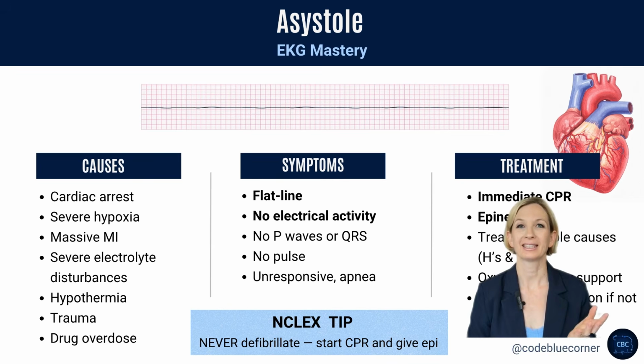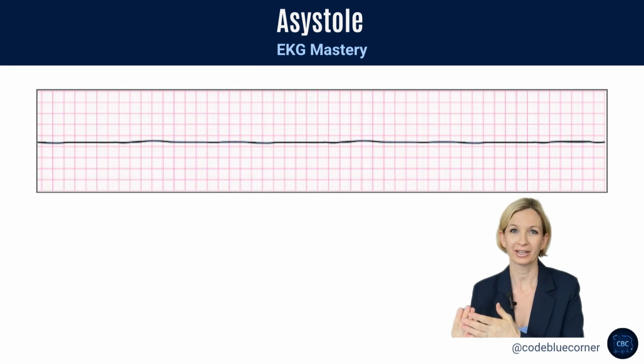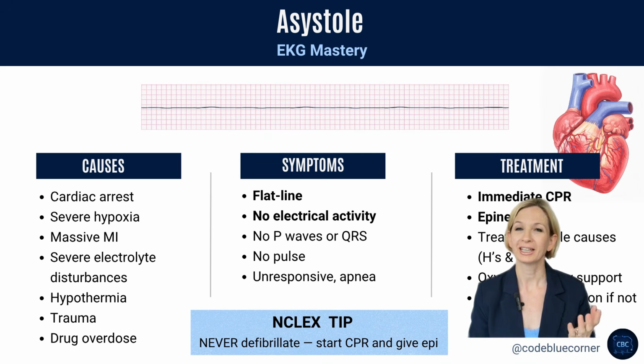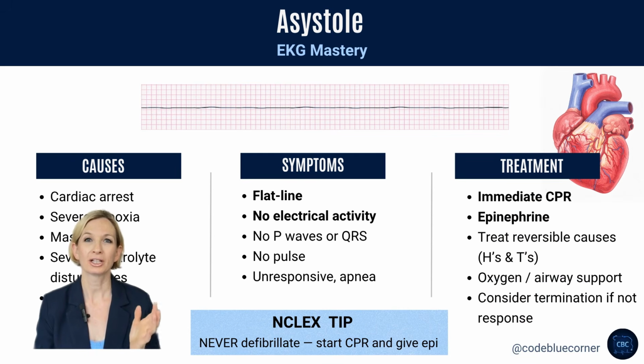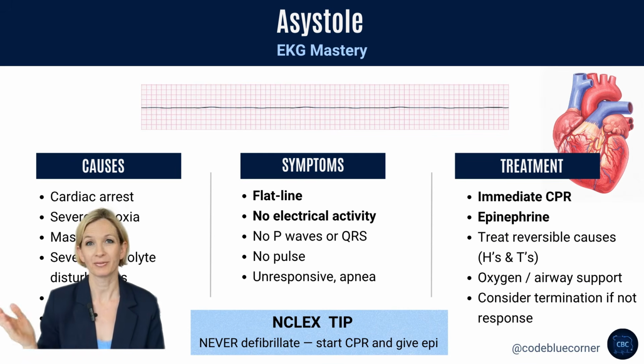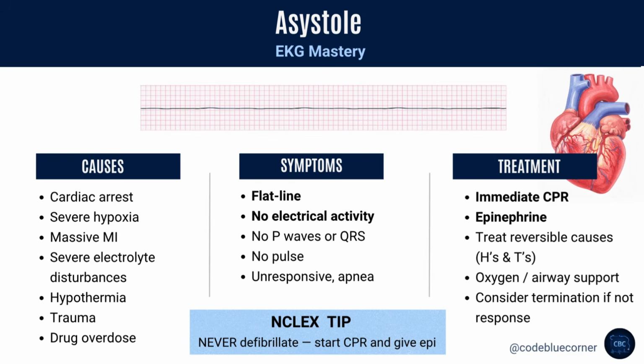This is asystole, a flatline. There's no electrical activity. First, always check the leads and make sure it's real. But if confirmed, this is a non-shockable rhythm, so do not defibrillate. We're going to start CPR, give epinephrine, and search for reversible causes.